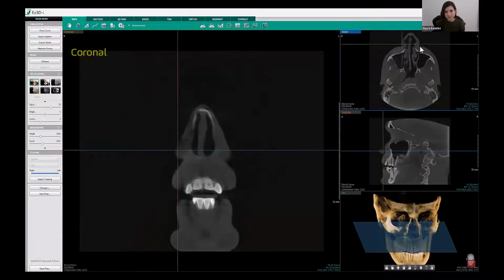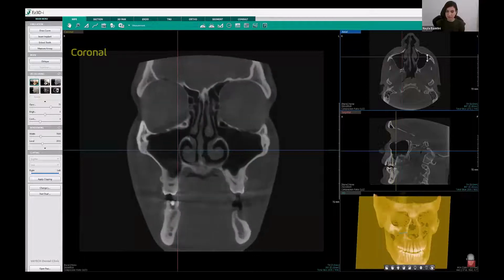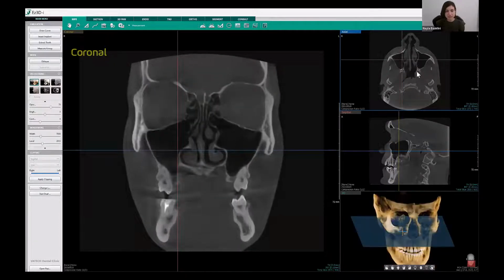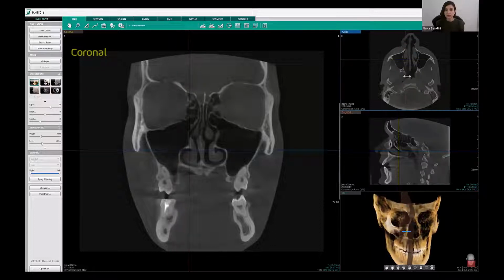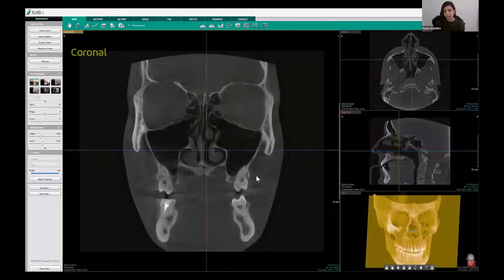And then when you move on to your soft tissue density areas, we know that CBCT is limited in really evaluating soft tissue density structures. However, it is important to look for any calcifications, any enlargements, any asymmetry. And then when you look at your air density areas, such as the sinuses, the nasal passages, the airway, we have to make sure also to look for any pathologies within or anything that looks abnormal.